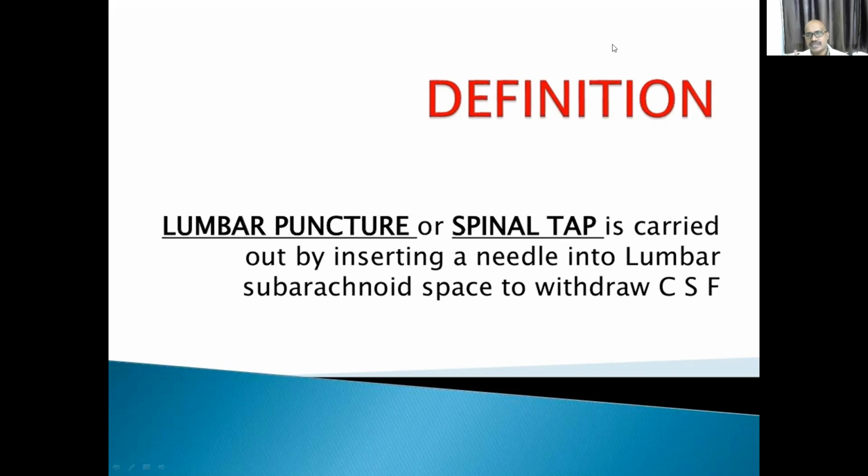The bone marrow aspiration needle is one, the lumbar puncture needle is one, and the other one is the liver biopsy needle. These 3 needles are there. Any one will be kept as a spotter for you.